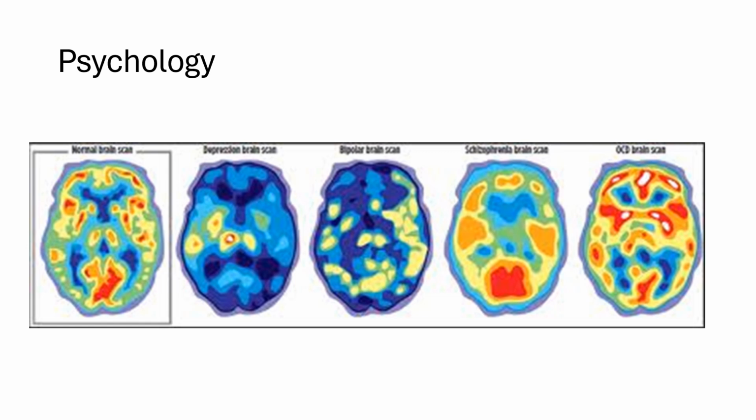The next one over is a patient who has schizophrenia and has visual hallucinations. And you see in the patient with schizophrenia, the occipital lobe is hyperperfused, which indicates that may be what's responsible for the visual hallucinations.